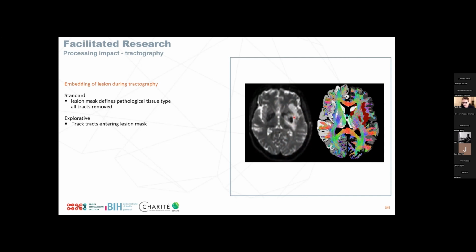So we see basically the core of the lesion right here, still being reproduced. So we still have the spot where we, in fact, do not have tracks because of the damage the lesion caused at the core, and we still track some of the surrounding tracks. Even though they are technically part of the lesion, we still want to be able to capture them to then really look into what the differences are and how we can better relate those to, for example, a stroke biomarker.